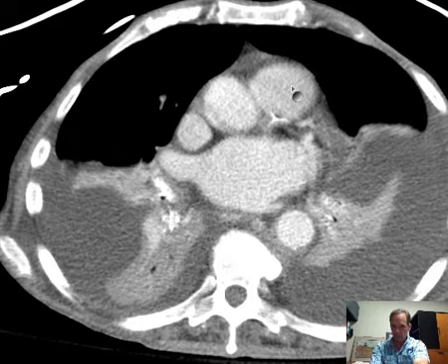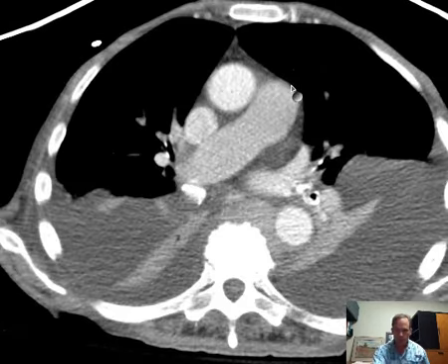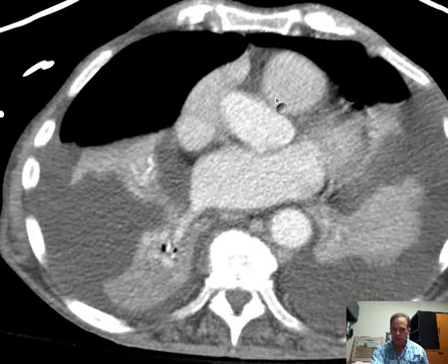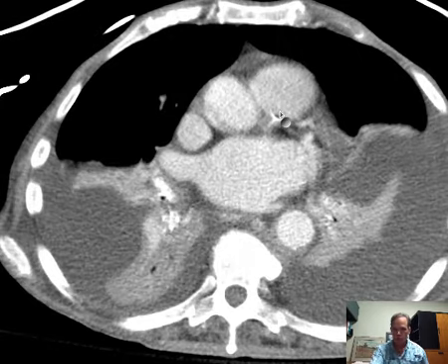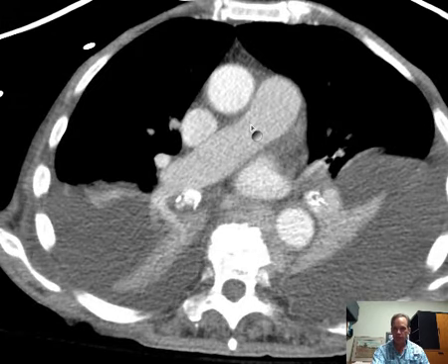So that's the main pulmonary artery, and what it does, and this is what a lot of people don't appreciate, is that it's very simple what it does. It courses up alongside of the aorta like that, has that little twist relative to where the two of them are, and then it simply branches just beneath the aortic arch.